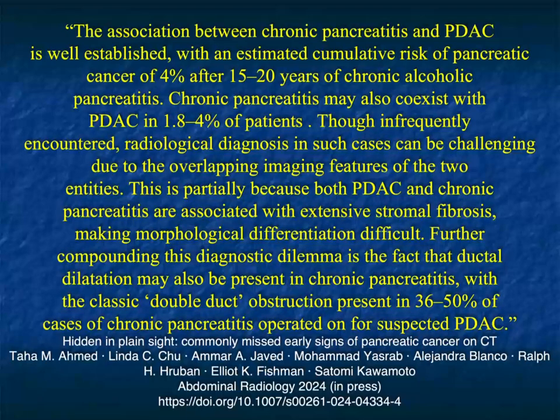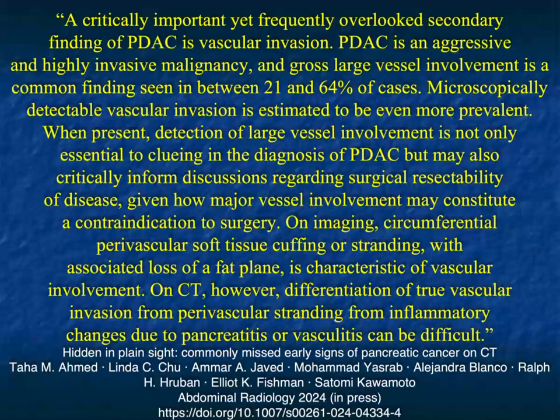Look very, very carefully. I know it's hard on CT, but when I follow studies, I look at the calcifications. Maybe there's more, maybe there's less. When there's less, you need to worry. More, you don't need to worry. But maybe there's displacement. And so what I worry about is, could there be displacement of the calcification because there's a tumor developing? So it's very, very important to look carefully. Sometimes CT is not definitive. MR can be helpful. EUS can indeed be helpful.